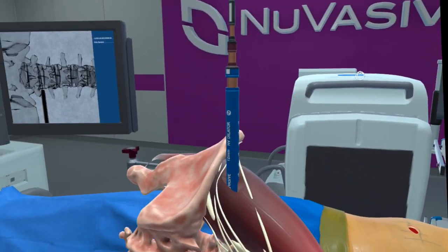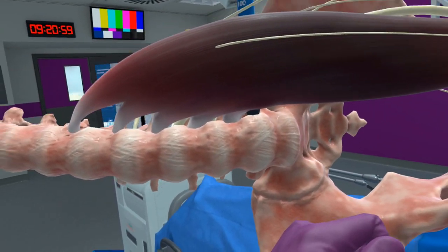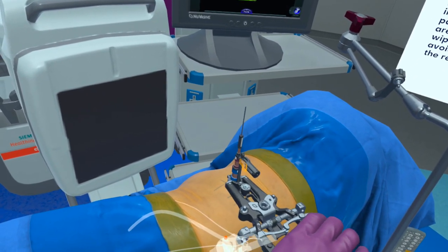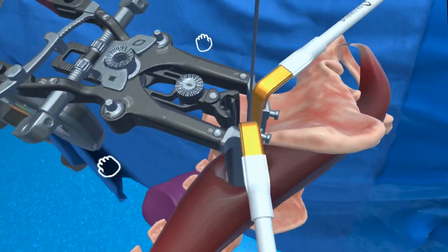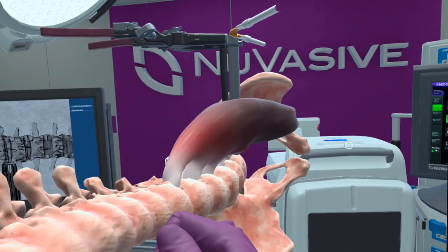During the case, I can still remove the bones from the body to visualize more direct placement and how I'm proceeding forward. I'll need to place retractors and position my instruments accordingly. Throughout the case, the software in the background can track metrics to 1/100th of a degree in terms of placement angles and positions down to fractions of a millimeter.